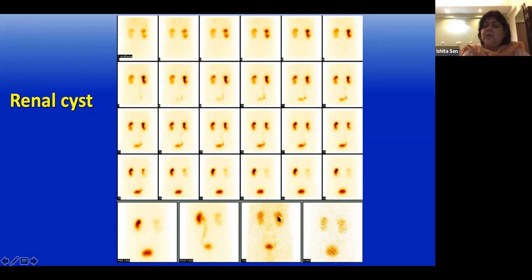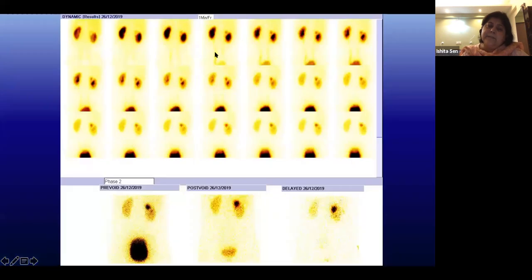This I just put up for this. So it's important not to confuse renal SOLs with dilated pelvicalyceal systems. The renal cysts, renal masses would often be more lateral, whereas the pelvis is more medial. So there is a lot of imagination which happens in renal imaging. So you have to really visualize what you're trying to see. But the thumb rule is that the pelvis is medial and most of the SOLs are lateral.